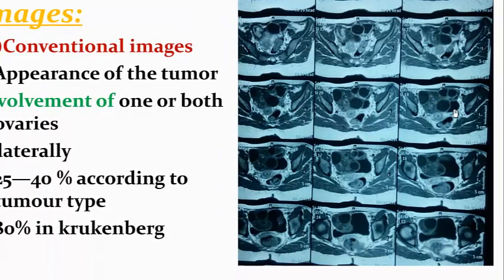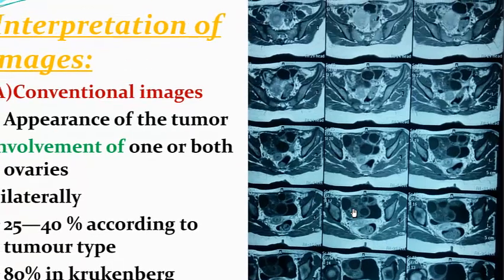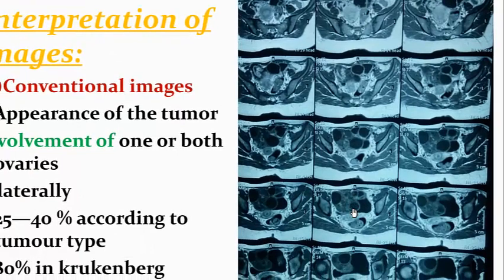In this lesion, we have bilateral enlarged ovaries. These are multicystic ovaries. There are multiple follicles, and the ovarian stroma is abundant. This is what we usually see in hyperstimulation or hormonal problems. And this is the other ovary, also multicystic. So is it neoplastic or not? I see that it was not neoplastic.